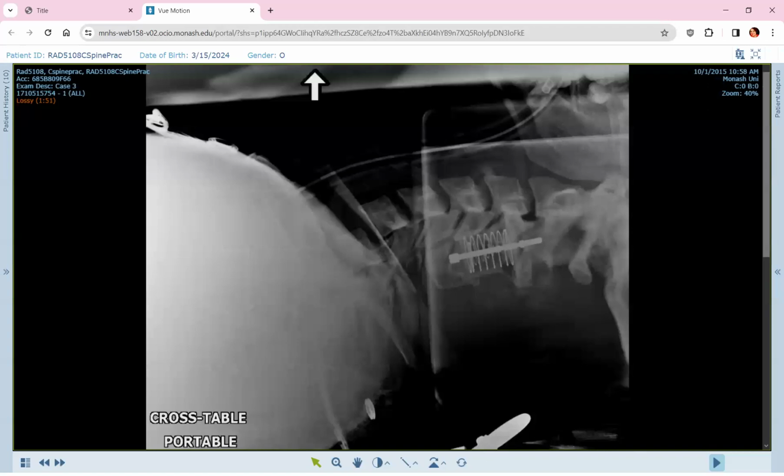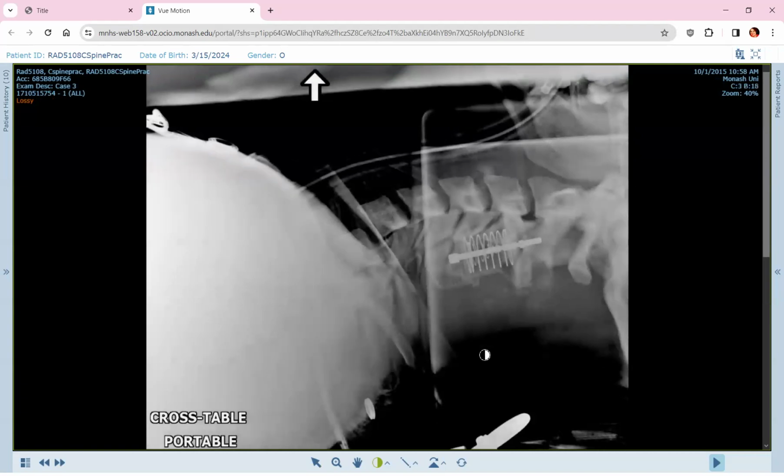And this one, I think I'll just make it slightly lighter. So on this image, if we count, that's 1, 2, 3, 4, 5, 6, 7, we can see that there is a big step from C6 to C7. This is very difficult to measure accurately, of course, as these are JPEG images, so we can't do an electronic measurement.